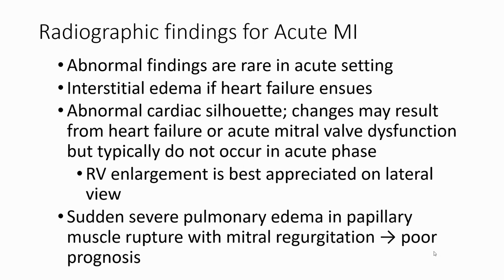This change may result from heart failure or acute mitral valve dysfunction, but heart enlargement does not occur in the acute phase. Right ventricular enlargement is best appreciated on lateral view. Sudden severe pulmonary edema occurs in papillary muscle rupture with mitral regurgitation. This is poor prognosis.